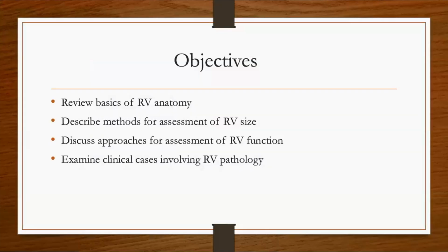We'll go over a little bit of the basics of the RV anatomy. We'll see some of the approaches to assessment of the RV size and function, and then we'll discuss some cases that involve right ventricular pathology.